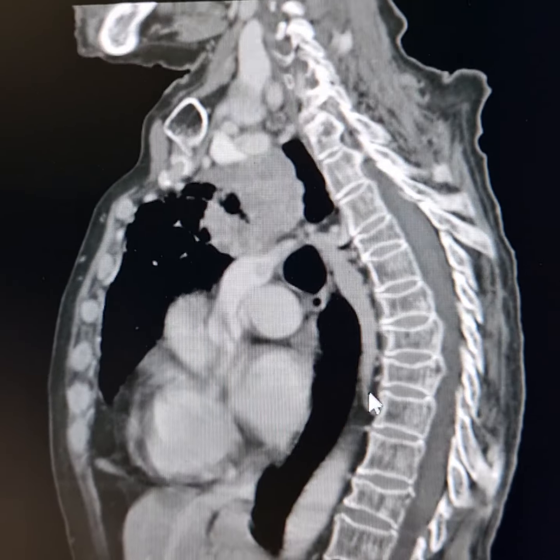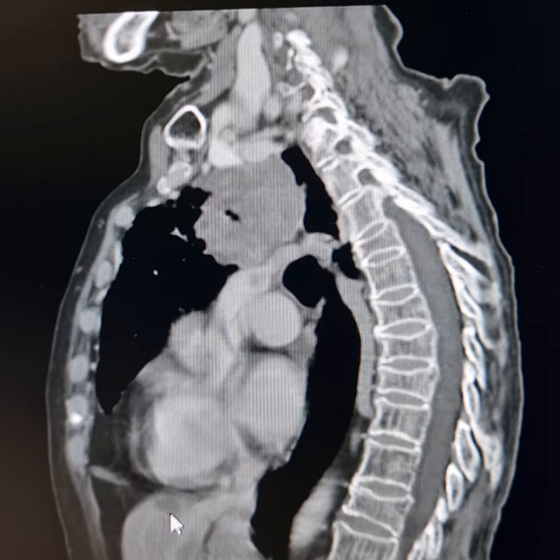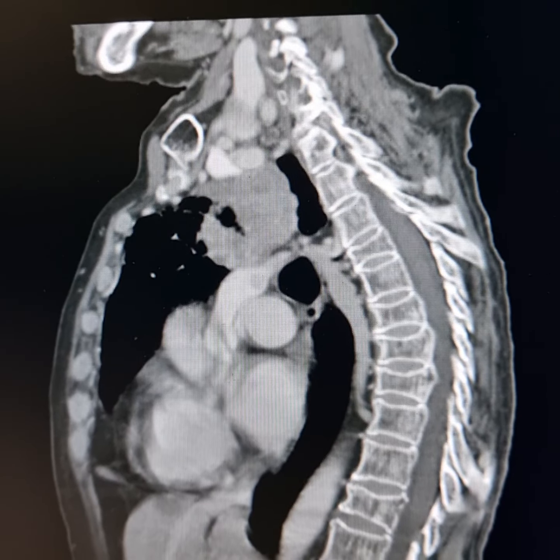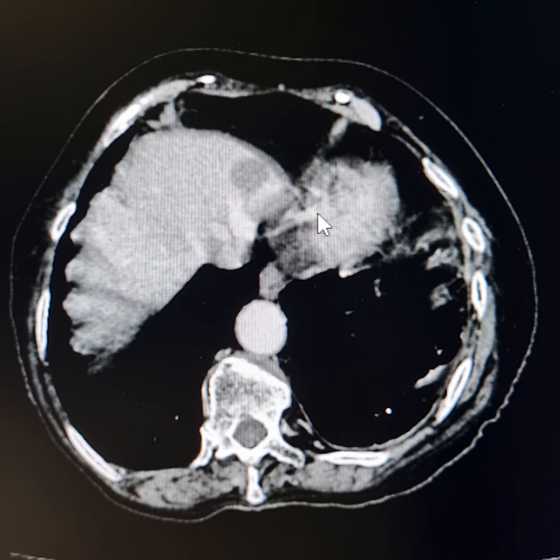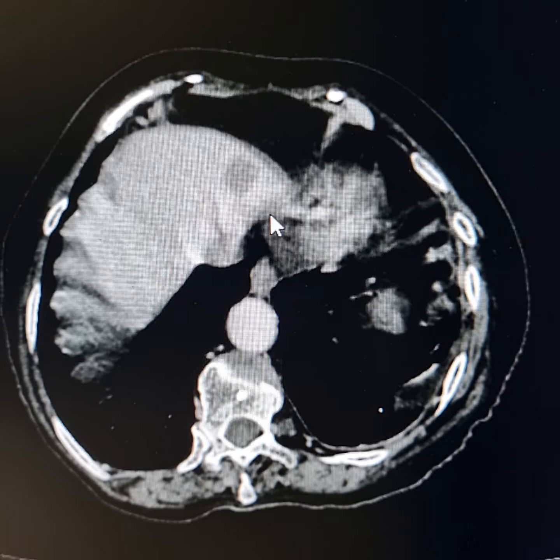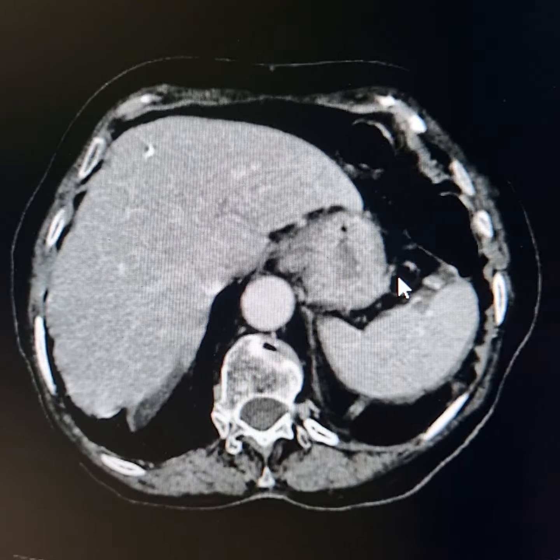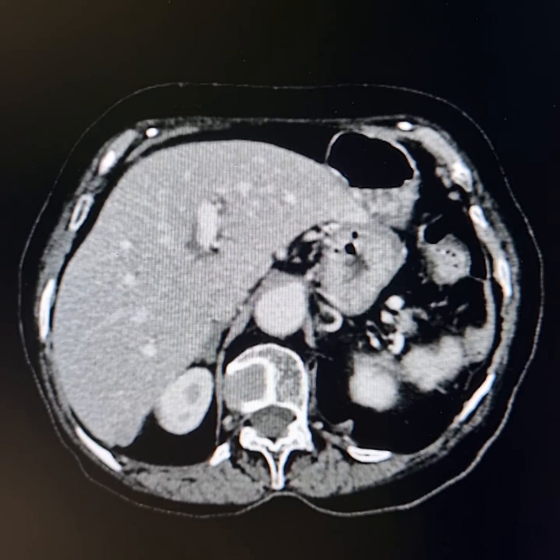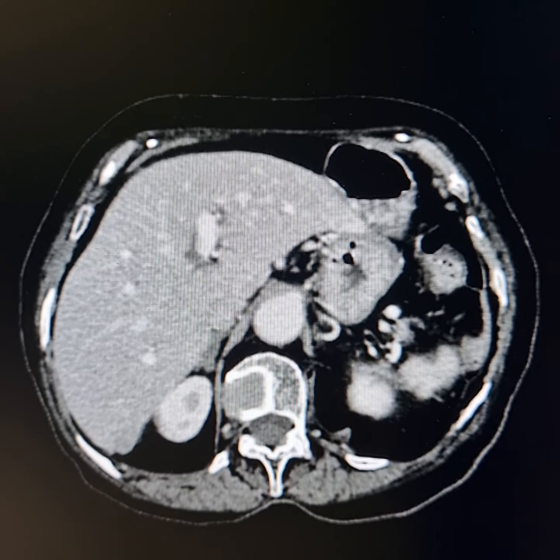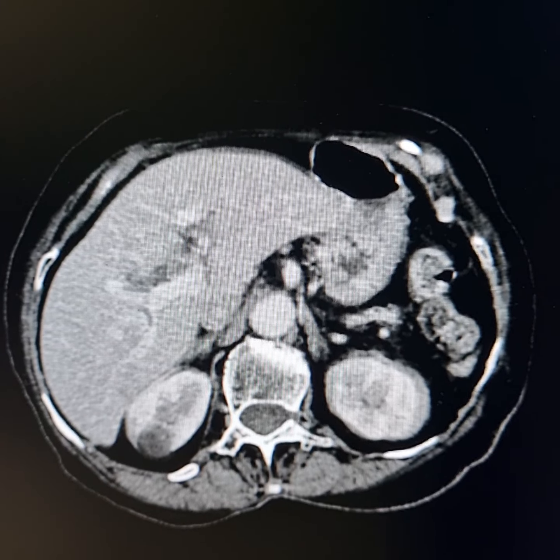Now please observe this nodular lesion in the upper part of the right lobe of the liver, this one here. I will show you on the... This is the metastatic lesion here, this one. This shows enhancement by the contrast medium. So this was a metastatic lesion. So it makes it a T3, N1 and M1 growth of the right upper lobe of the lung.